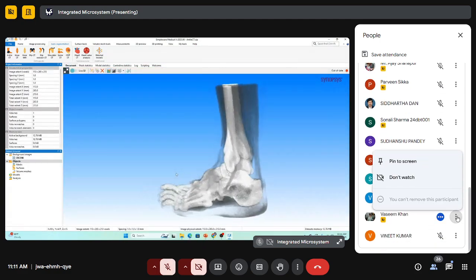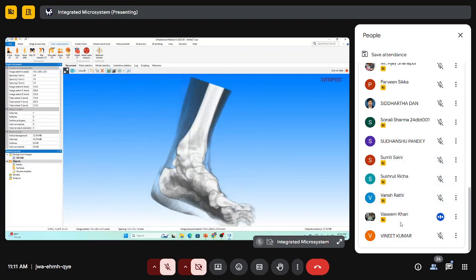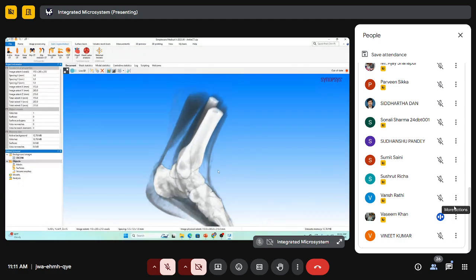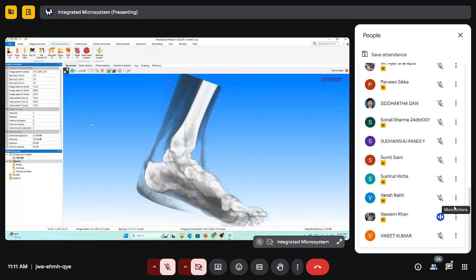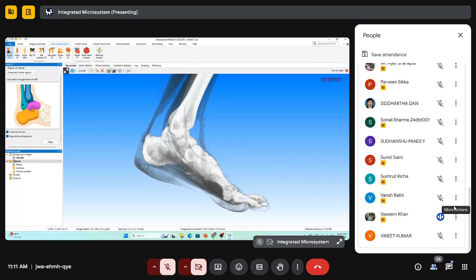So as we can see, this is a 3D image derived from ankle scans. So now we just have to click on this ankle CT and region of interest automatic segmentation. This automatically selects active background. Now we will select create landmarks also and keep all bone fragments. We will just click on apply.